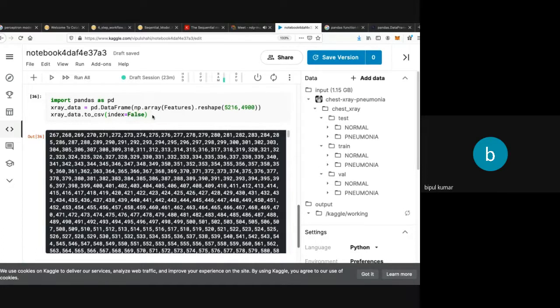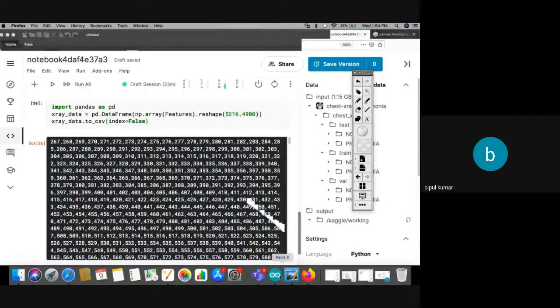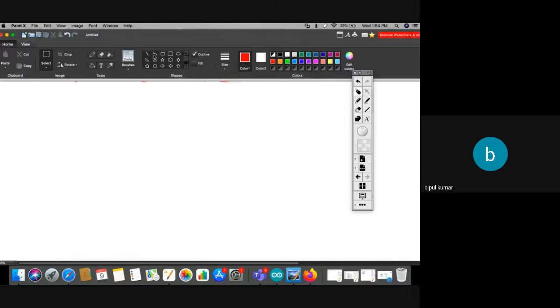Okay, so let me tell you what next we have to do. We have to make a function, a process to extract labels, and thereafter we'll create our model. This time I will create a functional model. Before creating it, let me explain the functional model in Keras. What is the functional API? Till then it will be done.